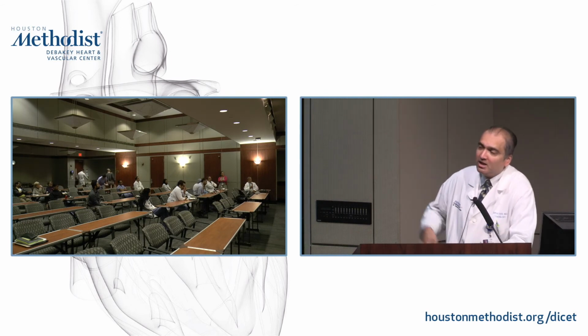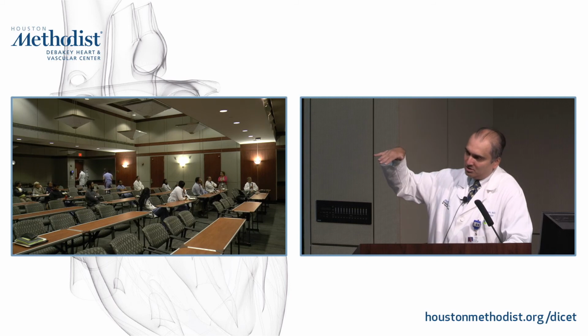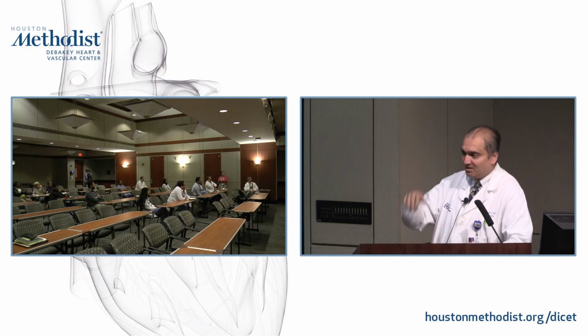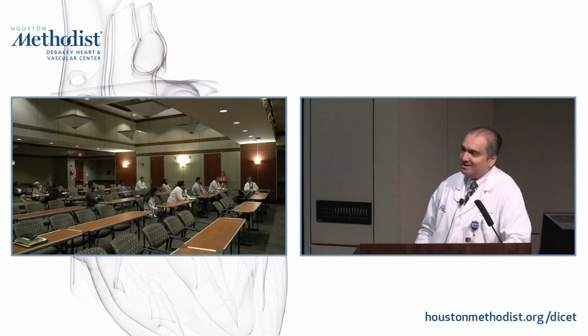the interest of time. For AI assessment, notice what I showed you on the graph was measuring it in the aortic root, just above the valve. There's actually a study that was done where if you go higher up the aorta, your reverse volume gets less and less, and that difference can be about 10 to 15 cc. In this particular study, comparing the level of the aortic root to almost a mid-ascending aorta, the difference was about 15 cc. So one of the reasons is, it depends upon which particular phase contrast location you're looking at.